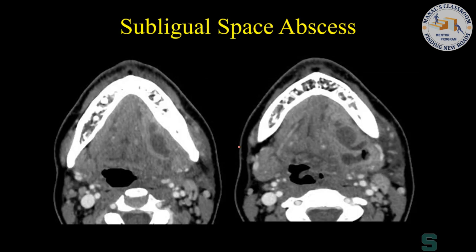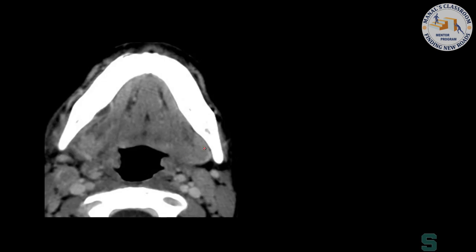We talked about this earlier before. What space is this in? Oh, don't look at that. Ignore that, right? Okay. Sublingual space. We know that we always have to look for the sublingual space abscess. Anybody see it here? A, B, or C? A, exactly right.